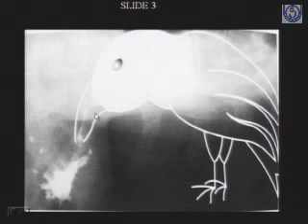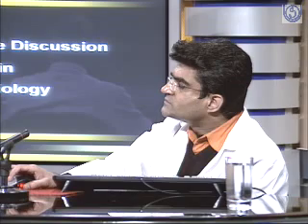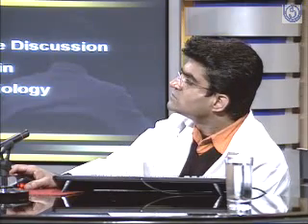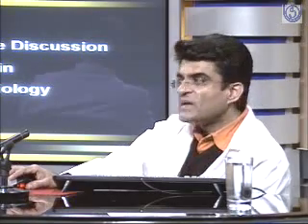Dr. Rajiv, in the first skiagram, you said in the upper part there is air in the esophagus, so only the border is seen. And on the lower side, you said that it may be the esophagus filled with water or some other thing. So if it is achalasia cardia, may the lower side be filled with some food material, which gives a contrast white appearance, and the upper side is filled with air, giving the translucent appearance? Yes, you're absolutely right. It is a mixed density.